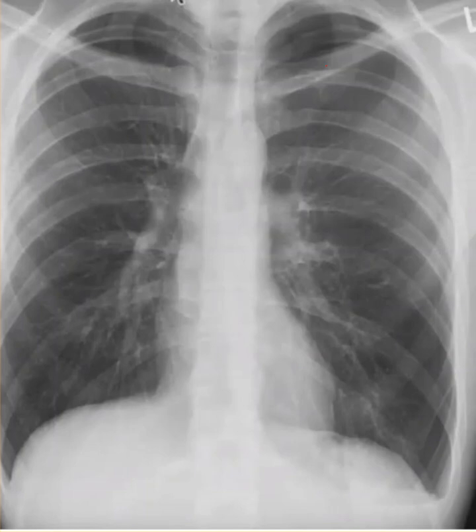Hey all, I thought I'd try a podcast of the chest x-ray that I posted a day or two ago. It was the 25-year-old male with complaints of shortness of breath for 3 days. And it turned out he had a pneumothorax, and I just wanted to go over it in real time, so to speak, and see if that helps any.